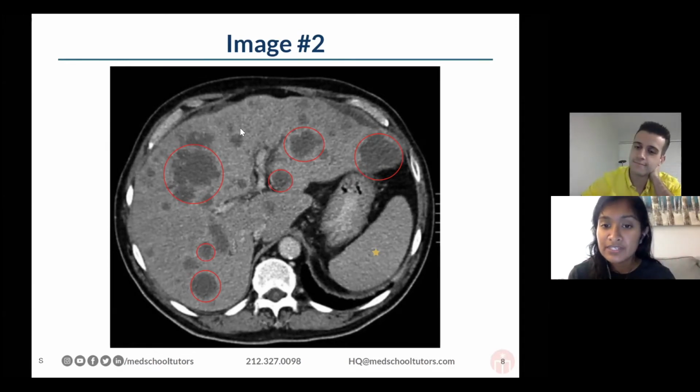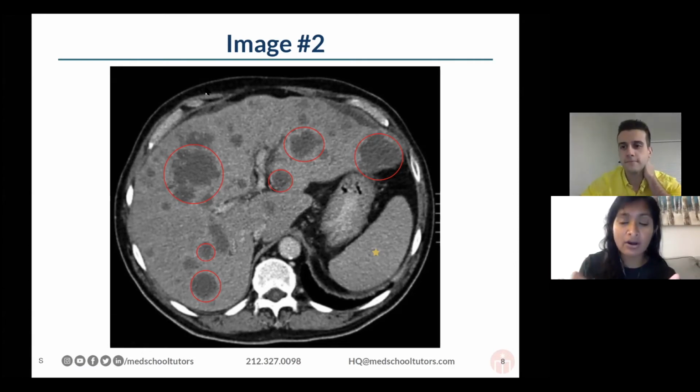And so you see these spots, I'll call them, very irregular. They don't have clear borders. Some of them are rounder. Some of them are more lobulated, as we say, almost like flowery appearing with the little outpouchings. And they're scattered sort of diffusely.